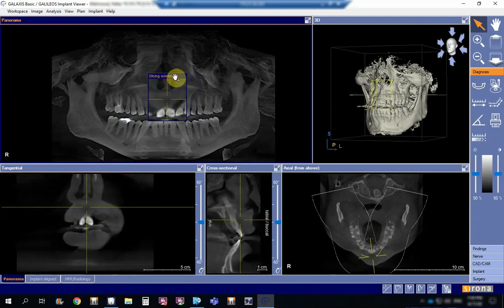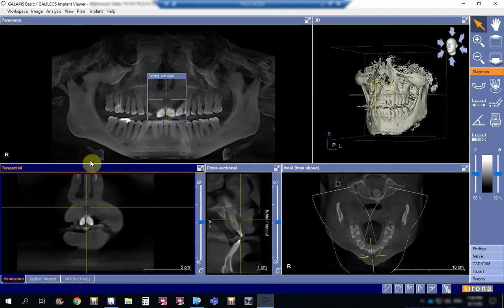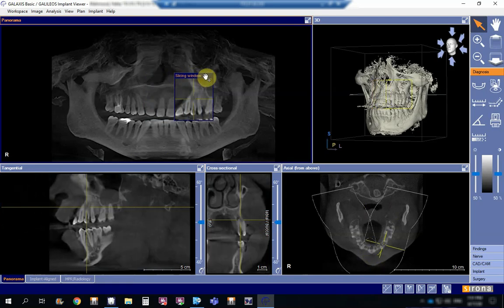If you go to the other side, I will take you to the other sinus over here. Here we are in the midline. See, here we have to have some kind of understanding. Here it looks as if it is a coronal view. Actually, it's not a coronal view. We are looking here at the side of the patient. The best view to locate here is to have a look at the axial and the coronal views, if you want the exact appearance.